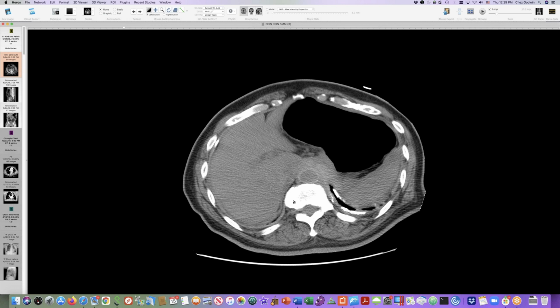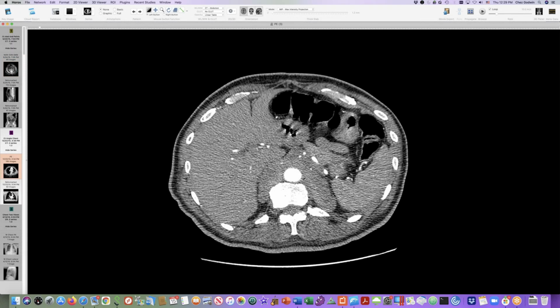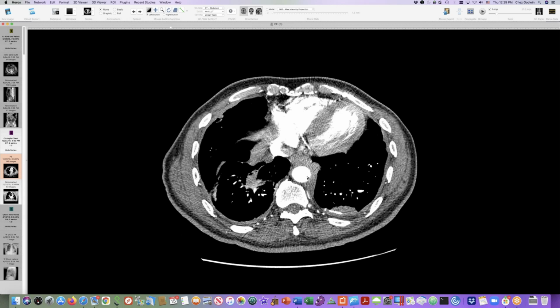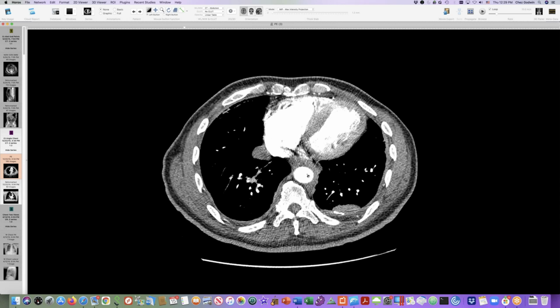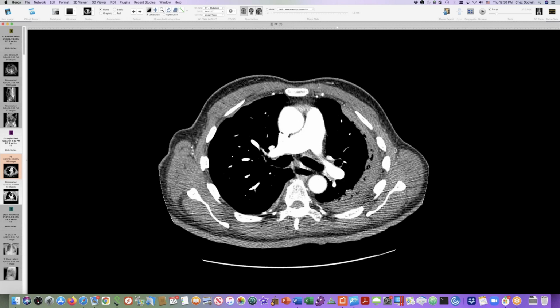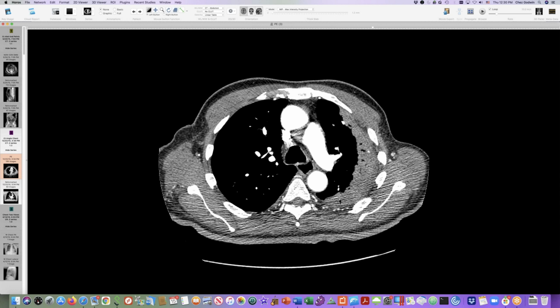And decades ago, we had a diagnosis of a cause of his abdominal abnormalities here. So let me show you his abdominal CT. First of all, here's his calcified plaque from asbestos exposure. And then here is all of this tissue around the aorta in the lower chest and upper abdomen. So he's got retroperitoneal fibrosis.